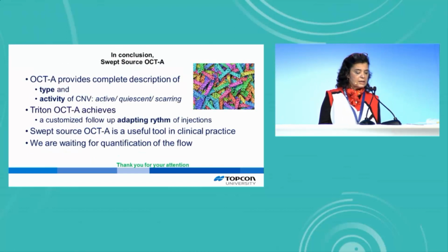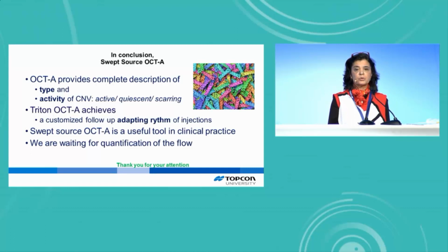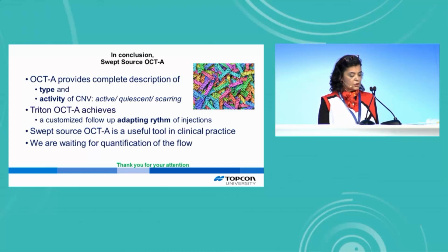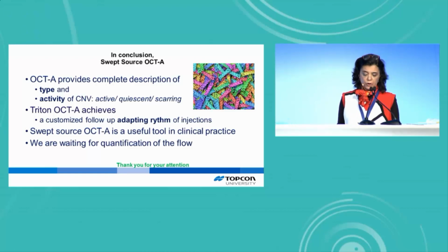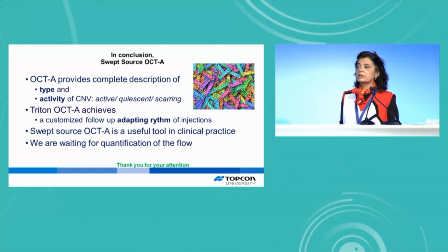In conclusion, OCT-A provides complete description of type and activity of CNV, active versus quiescent versus scar. Triton OCT-A achieves a customized follow-up adapting rhythm of injections. Swept-source angiography is a useful tool in clinical practice, and we are waiting for quantification of flow.